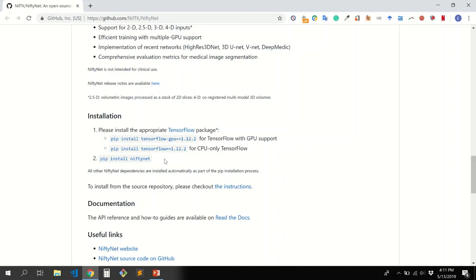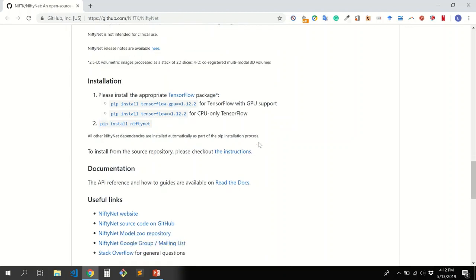You can choose the installation of TensorFlow for CPU or for GPU. Also, all the libraries required for TensorFlow, like NumPy, and maybe Matplotlib for plotting, and the other ones to execute. So in order to avoid creating more instances or more libraries installed on your machine, we will use the Docker approach. That is very nice.